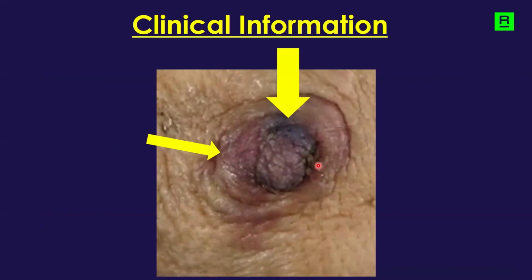So just looking at the imaging here, I know as radiologists, we're so used to looking at pictures, but sometimes we forget to go look at the patient. Is this infection? Could this be a reactive dermatitis due to trauma? Maybe this is a bruise, and the patient's just embarrassed to say how she got the bruise. However, this skin discoloration was not resolving. Could this be a recurrence of her prior breast cancer with some locally advanced changes, or perhaps even a new primary?